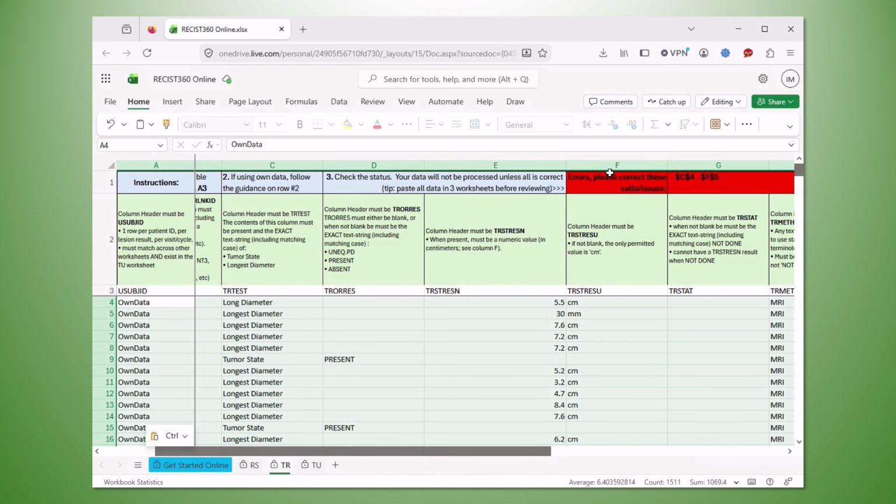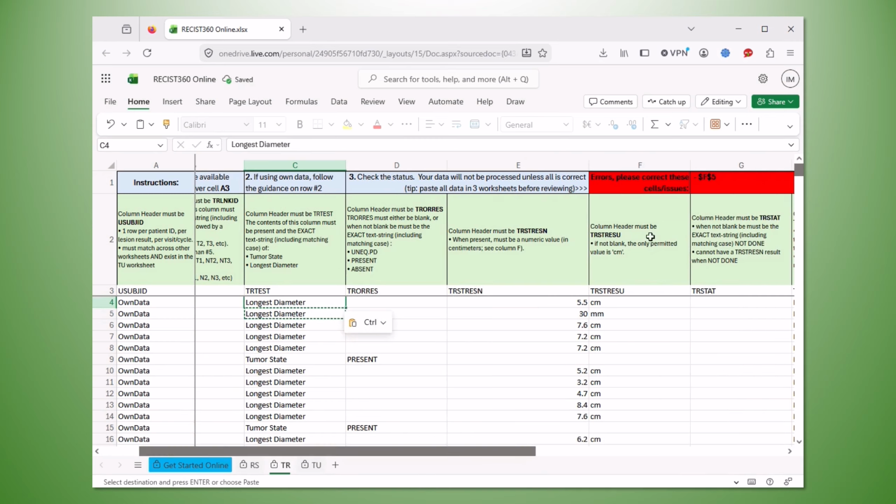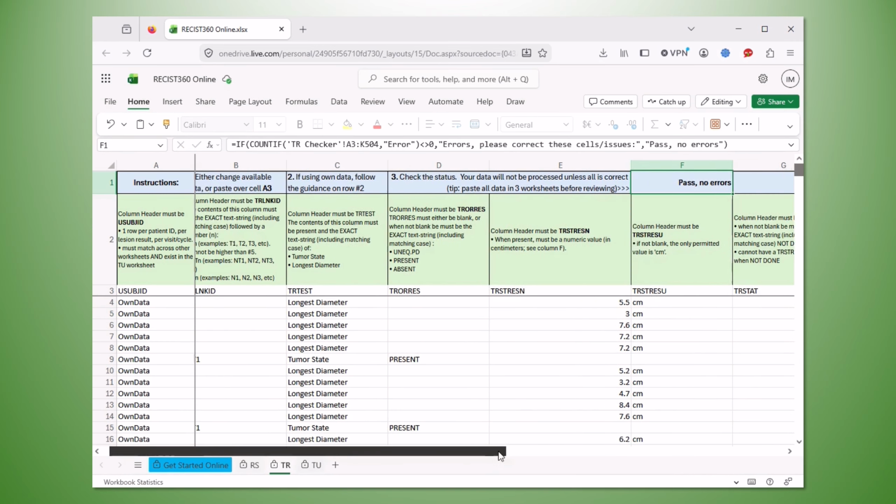But keep in mind, for the tool to accept this data, it means the structure of data needs to match the specifications detailed on row 2 of each worksheet. If you wish to test a significant amount of data, we advise you perform a find and replace on texts offline before using this facility. The facility will direct you to where you have not met the required data structures. Failure to correct means you will not get returned output.